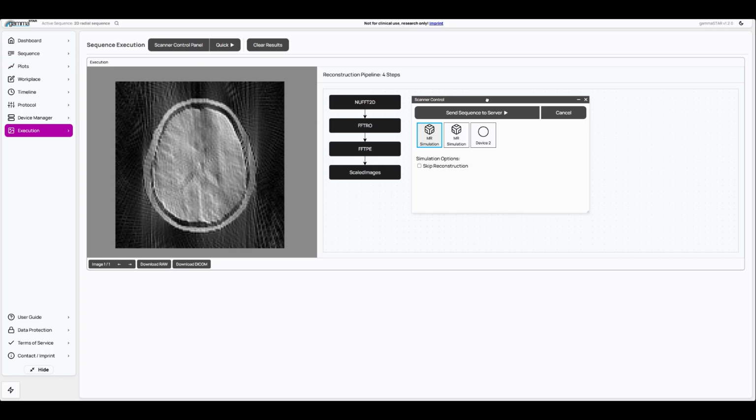The interesting part is that now you see that the image quality is not very nice. So we see all these types of artifacts or stripe artifacts in that image, which is quite common for non-optimal radial sequences where the protocol settings are not optimal. And in this case, it's mainly related to the fact that the TR is quite short, so we are not in steady state.